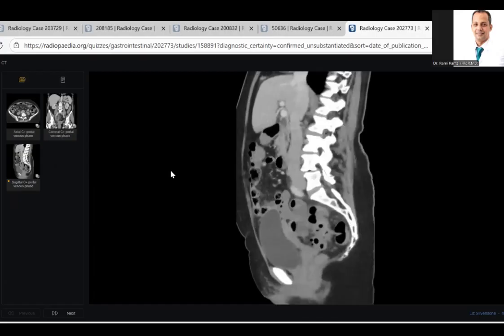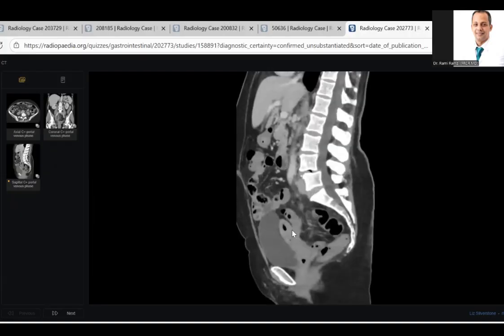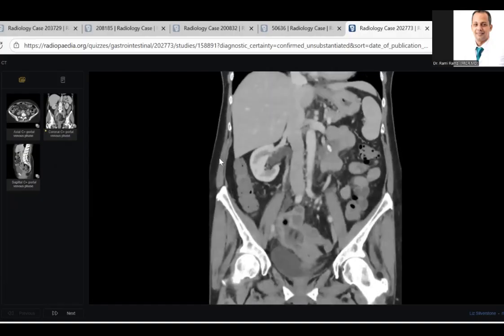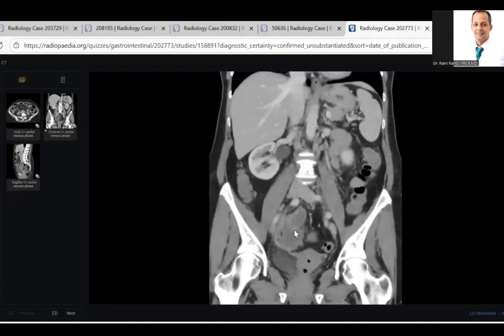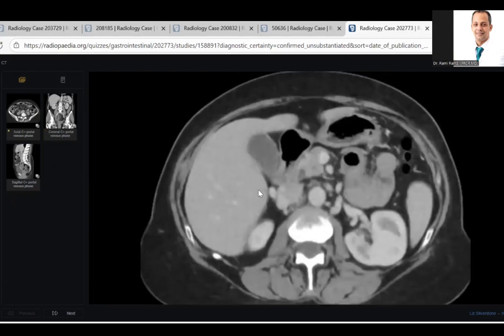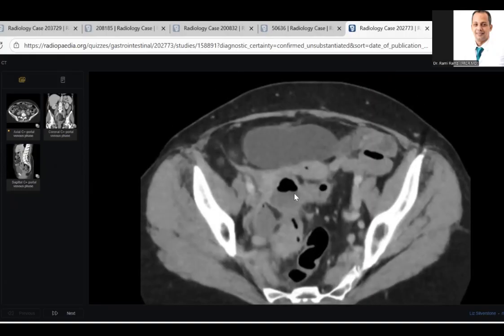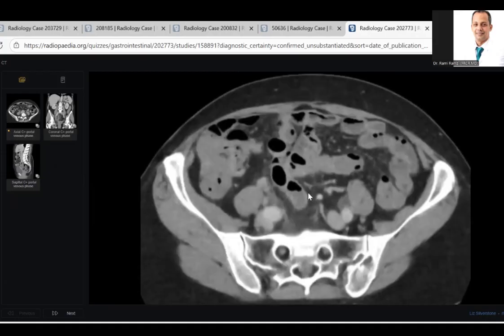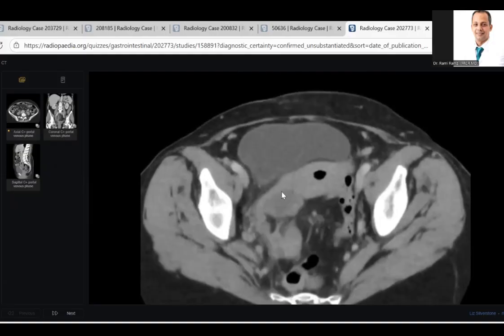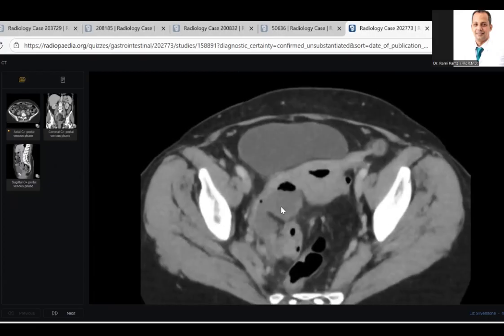Here, what happened? Collection between the uterus and the colon and the diverticulosis. So, by expectation, she expected the scenario. It may be that the diverticulitis causes this abscess and fistulized into the uterus. Very good expectation. Okay, acceptable. This is the colon, sigmoid colon. It is really abutting the tubes and the adnexa. See, mainly abutting the right tube. So fistulation occurred almost here because this is the site of abscess here.